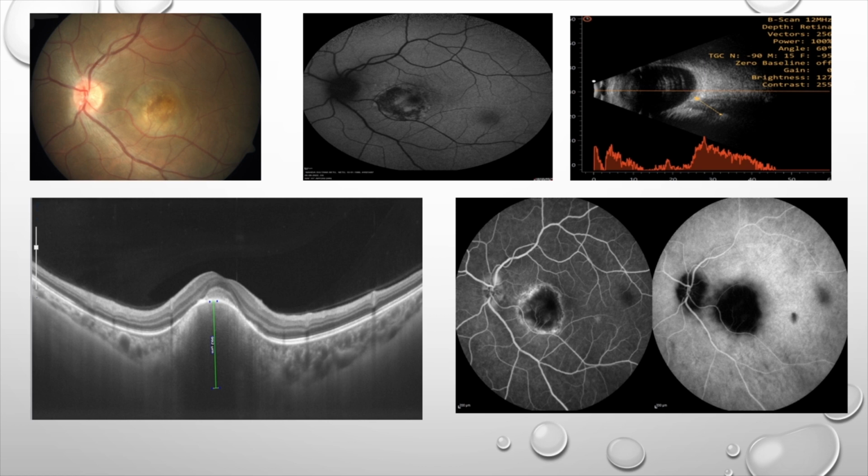We are assuming that the curve is the same as the choroidoscleral curve on either side. I think that is what you mean by estimate. But yes, in a case where you have a heavily pigmented tumor like this, it's difficult to measure the height on OCT. You have to find an area where you're clearly able to see the choroidoscleral interface. Otherwise, you have to rely on the ultrasound.